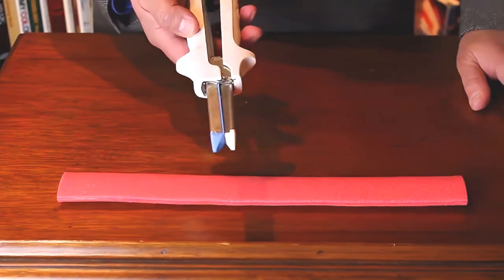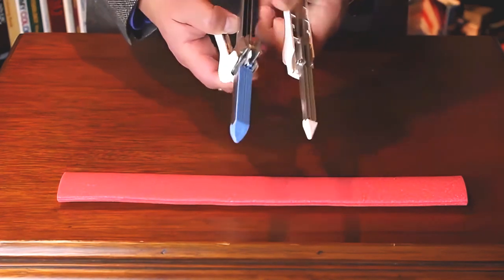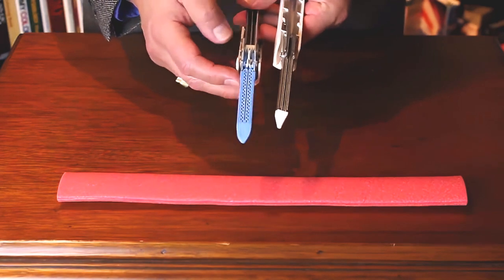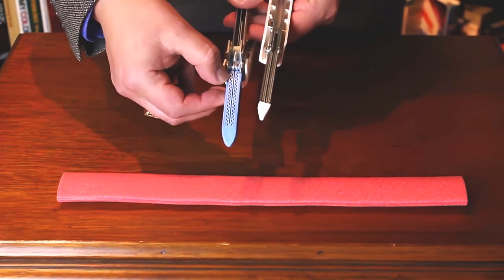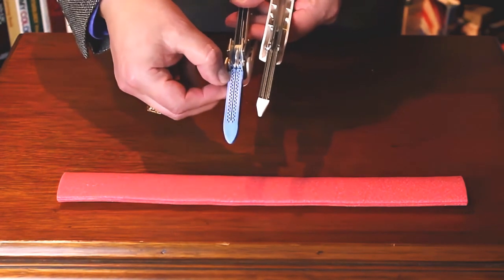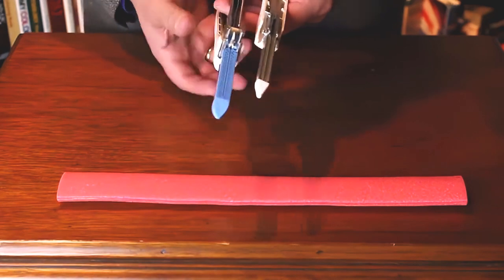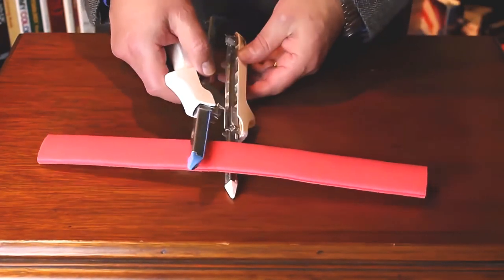This is a linear cutter. A linear cutter consists of two halves, an anvil half and a cartridge half, and you can see it is made up of two double staggered rows of staples plus a cut line for a knife. The instrument is placed on the organ that needs to be transected.